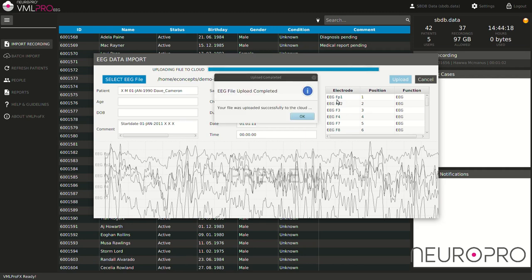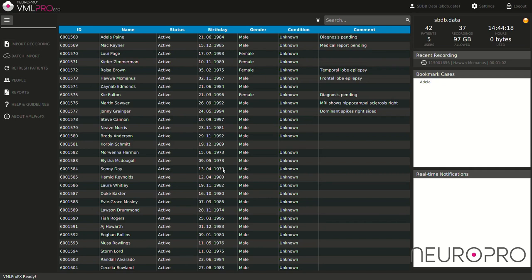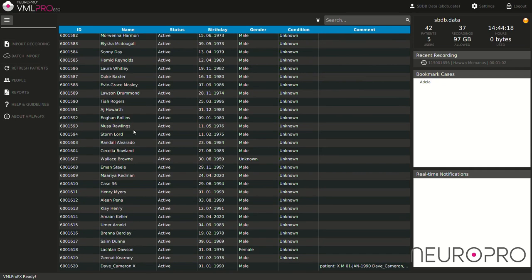When the uploading is done, click on Refresh Patients. Scroll down and you can find the newly added recording.